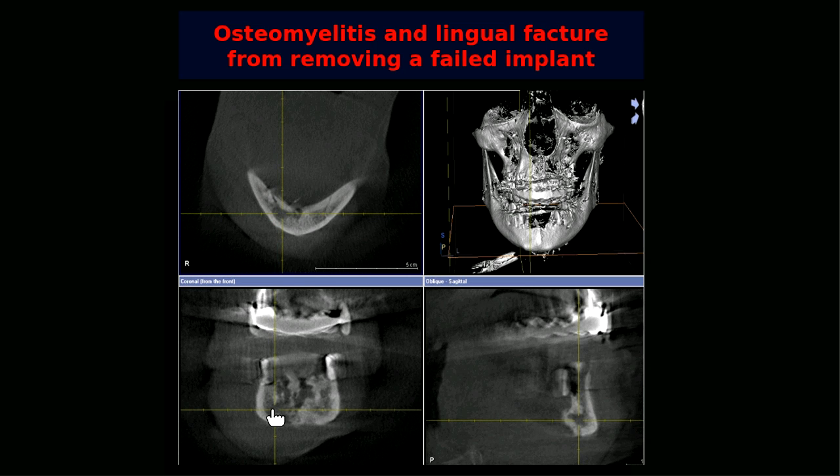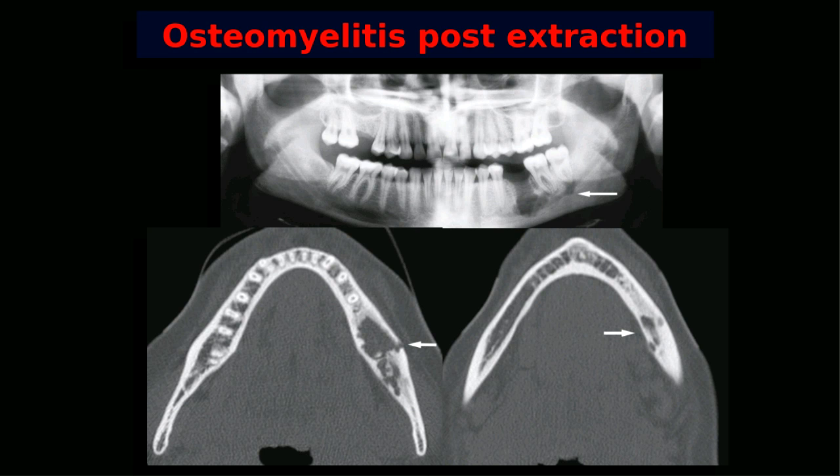And that's the area where the implant failed. And we don't want to encounter this in our practice. So we don't want to see this kind of pathological fracture after our treatment.